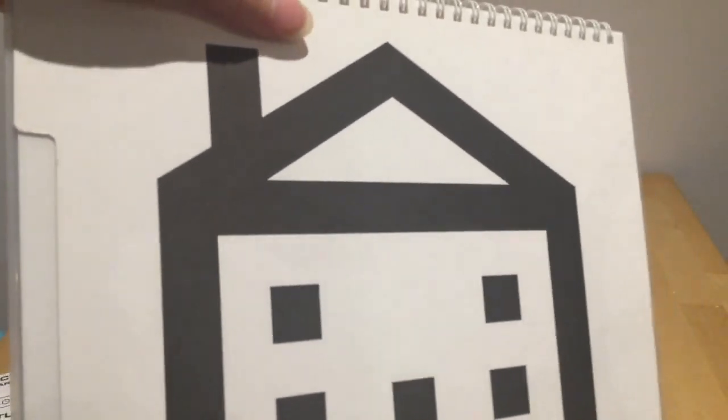So there we have our house at size 60. Okay, so that would be fine to use that one. The child could either tell you it was a house or they could match it on the key card. So you might choose to do them all, although that's quite a long test. If that one was correct, you might then go down to the 36 size.